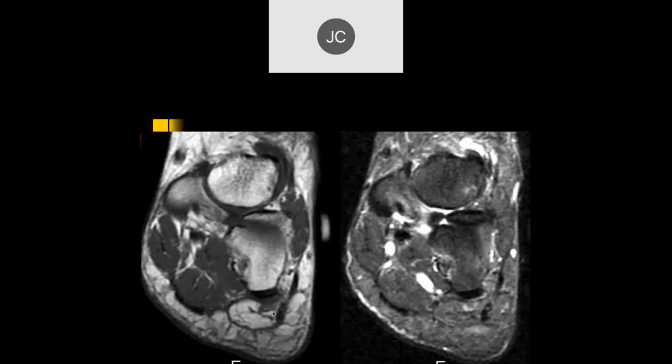Now, it's generally thought that Baxter's neuropathy is relatively uncommon, but in a study, I think I may have a reference to it in one of my slides coming up, that was done a number of years ago looking at adults who had MR examination, it turns out about 7% of adults will have extensive fatty atrophy of the abductor digiti minimi, and it's thought that the classic process of Baxter's neuropathy is not anywhere near that common.